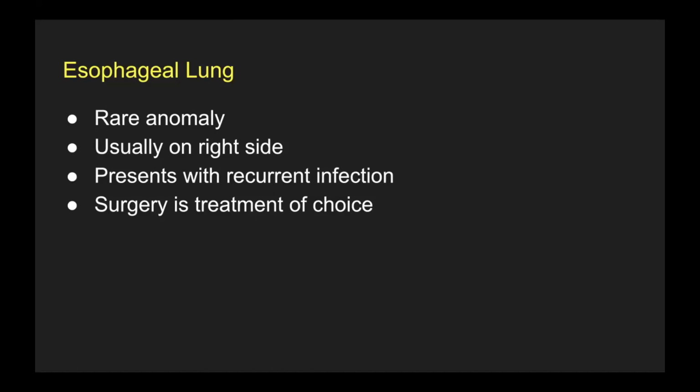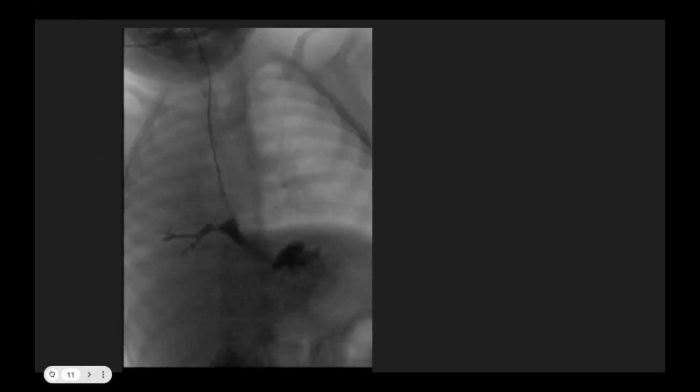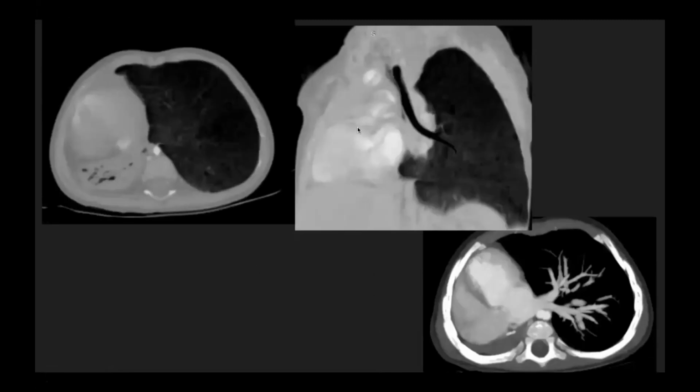So this was the first case of opaque hemithorax. I'm going back again to show the contour of the trachea and the carina. There is no carina. Where the trachea should branch, there should be an angle formed. We cannot see that angle. Instead, it looks like a smoothly curving trachea going into the left main bronchus. This should prompt us to think that either agenesis or some other anomaly is there.